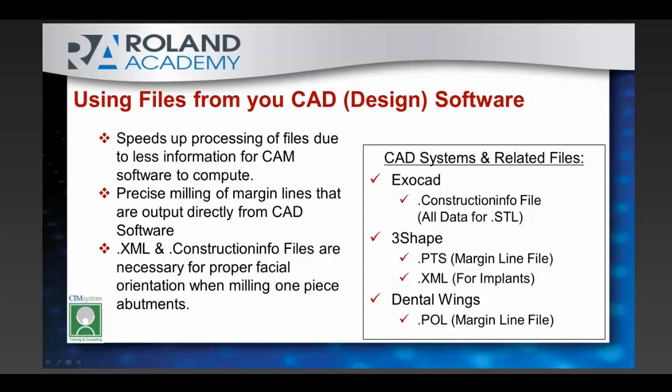But the more important part is you're getting the precise placement of that margin. As some of you may know as well, you also have some milling operations that concentrate on the margin. This is where this would come into extra importance, because you want the tool to travel right along the margin. You don't want it skipping back and forth over the interior and exterior portion where you could cause chips in the milling. So those are the primary importance behind those extra files.